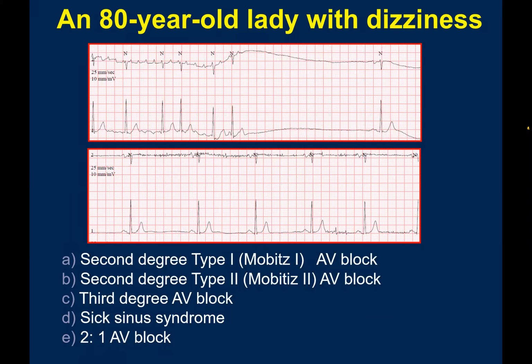So if you see this tachycardia and then pause and then bradycardia, what do you call this? Sick sinus. Sick sinus, which is the common variant of sick sinus in the elderly, the tachy-brady component.